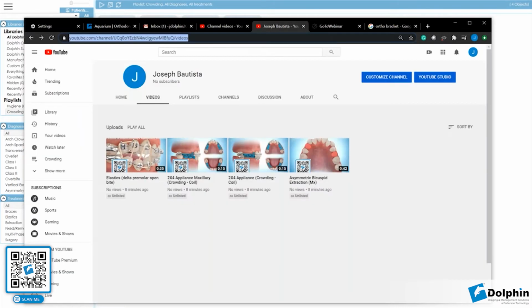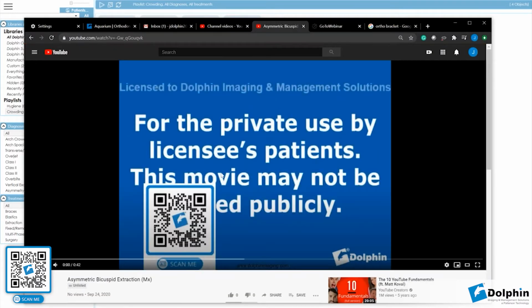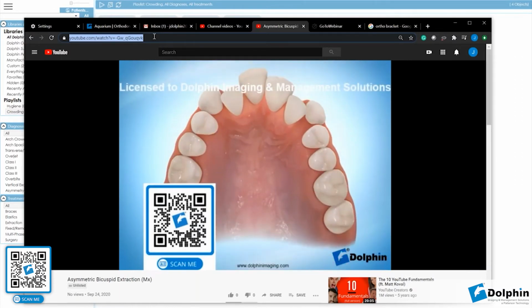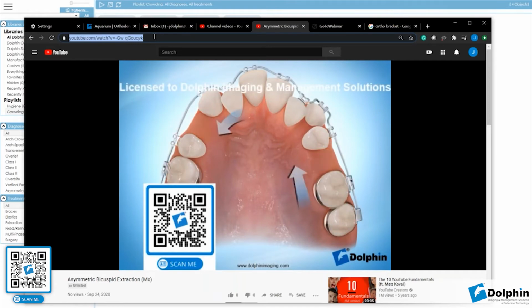From here, once it's uploaded to YouTube, you can see I have a couple of my videos already uploaded. Now from here, I can click on any video and play it, and I can also email this link to the patient. So rather than exporting content out of Aquarium, a nice, easy way to do this would be to email the patient a link for them to view on any of their devices.